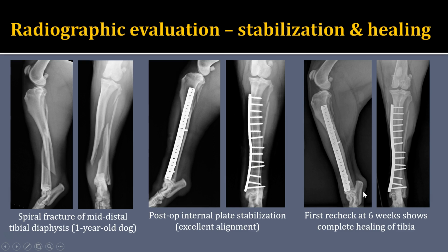And here at the first recheck, which in this case was taken at 6 weeks, so depending upon the patient and the fracture type and surgery, they may not do 4 weeks. I cannot any longer see that fracture line. I see continuity of the cortex and the medullary cavity. This proximal fibular fracture really hasn't healed, but that's not a weight-bearing fracture, so we probably won't have to worry about it.